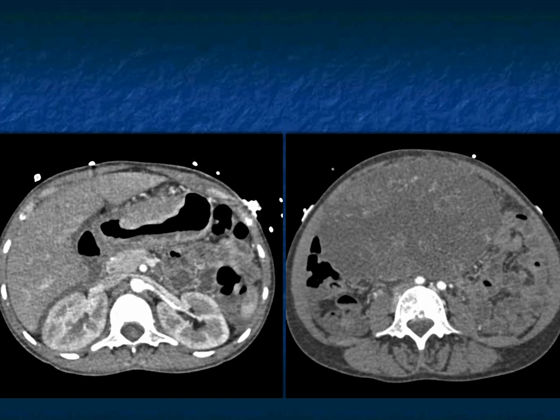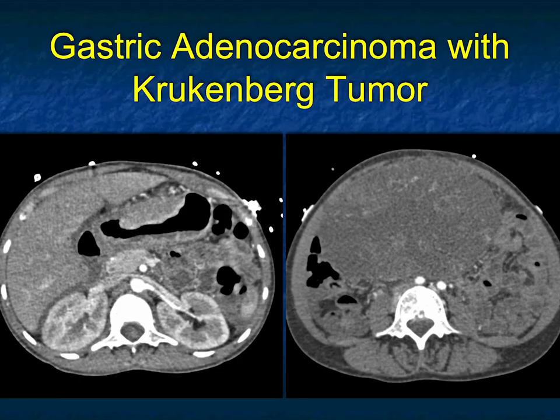Again, you would look, because it could be uterine in theory, but it looked ovarian, and you have a mass in the stomach. So I wanted you to think about what gives you a gastric mass and an ovarian mass, and the diagnosis would be a Krukenberg tumor. The metastasis from Krukenberg tumors, gastric adenocarcinoma is the most common. You could also think about bile duct tumors, other mucinous tumors.